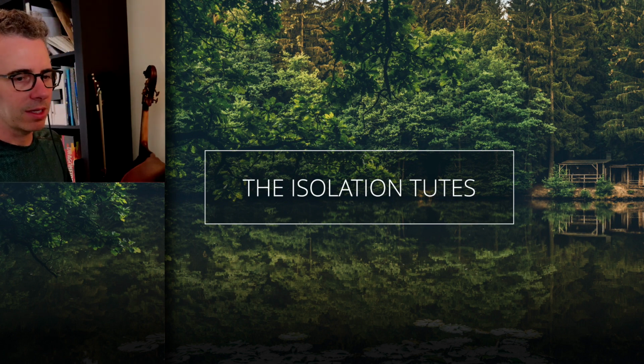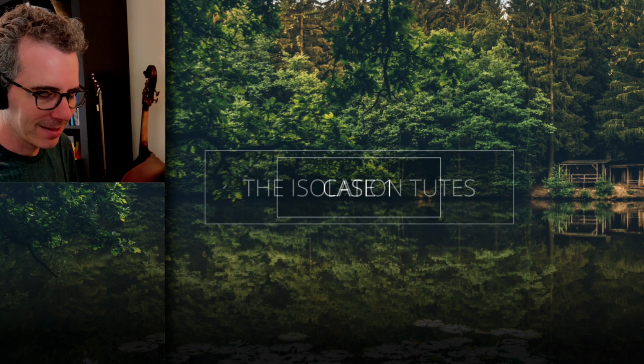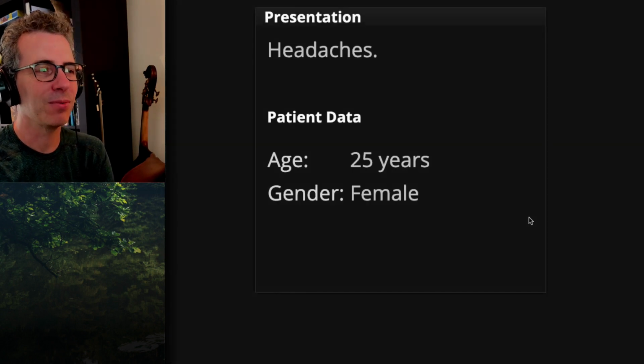Okay, case one. It's always hard when someone says it's a warm-up case, right? Yeah. You'd much rather someone saying this is really hard, there's no chance of you getting it. Exactly. This is a really easy one.